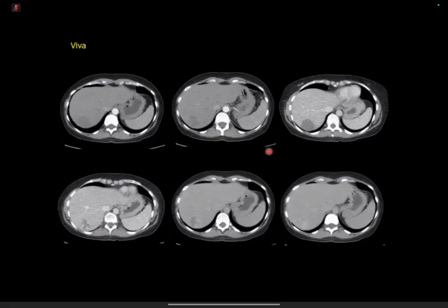These are selected CT slices through the liver in different contrast phases, from the right to the left, arterial to delayed. On arterial phase there is a hypoenhancing lesion in the right lobe of the liver, demonstrating peripheral nodular enhancement, with more nodularity to the rim, and there's a centripetal pattern of filling on the delayed image.